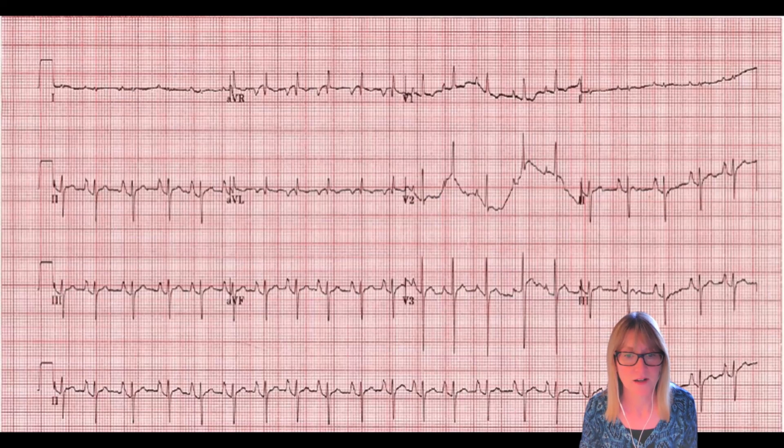We do have a rhythm that looks fairly regular. There's a P for every QRS and a QRS for every P. The P-QRS distance, or PR interval, looks very consistent, so I think those events are associated, and the Ps are positive in lead 2. So, a rapid assessment of what I think looks like a normal sinus rhythm.